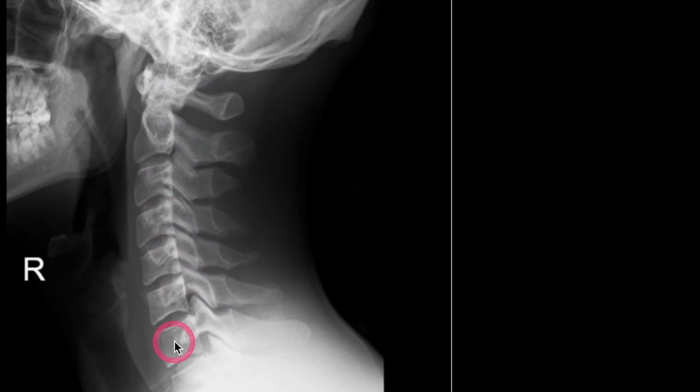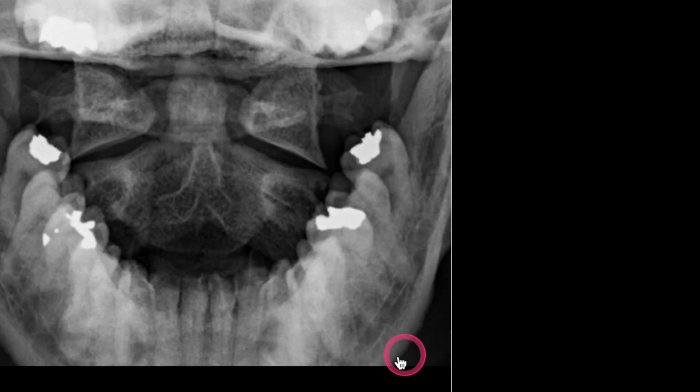And then one thing that might pop out at you to give you a clue what vertebra you're looking at, this is C7, and it's going to have the most prominent spinous process, usually. In this picture, it depicts it as very prominent here in the back. One clinical correlate I think is fun to bring up here is X-ray acquisition dedicated to the odontoid process.